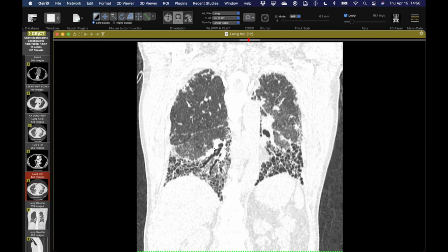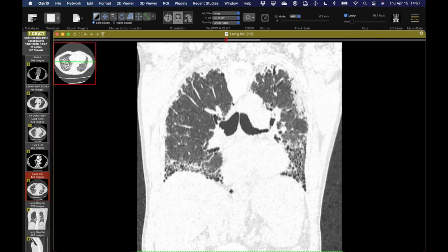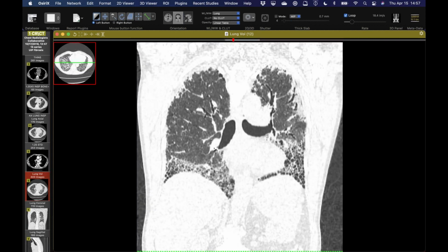So this was his most recent scan, and you can see it's progressed, and that honeycombing has become even more exuberant. We're starting to see larger cystic spaces, but it's markedly noticeable in the lower lobes. He's got now traction bronchiectasis, but this is out of proportion. We see bad IPF, but usually you don't see this much honeycombing. Or if you do, there's a lot more upper lobe disease.